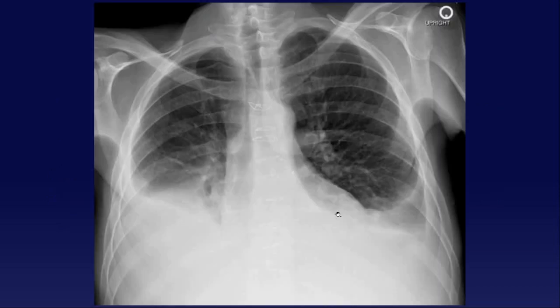Here are some examples of effusions. Now, you have opacity at the bases, and see it has what they call a meniscus sign. See how it kind of goes up on the sides like this? Kind of like when you were doing chemistry in college, how in the volumetric beakers the fluid would go a little bit up on the sides and you were told to measure at the bottom of the meniscus. That's because of the surface tension of water, and this is typical of pleural effusion.